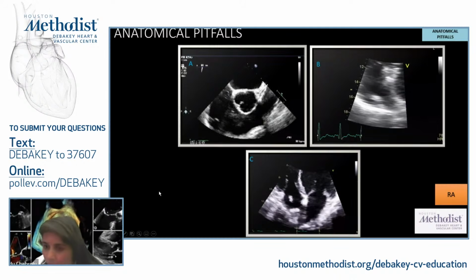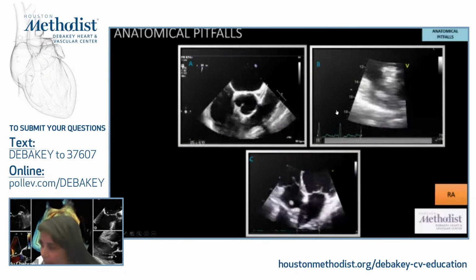All right, let's take a quick look at these videos. I'm sure you can identify probably all of them.